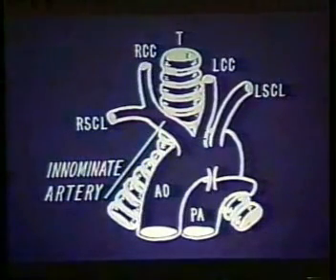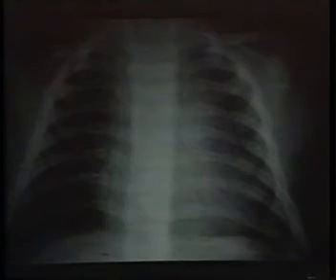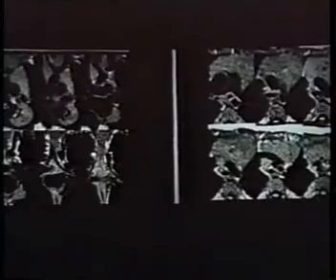These patients will have normal esophagrams, usually normal chest films, but the abnormality will be recognized at bronchoscopy, and then you proceed to MR. This patient has normal chest films and clearly had respiratory stridor. The lateral chest film demonstrated some anterior compression upon the trachea, but you can see this in many normals. The esophagram, illustrated only for completeness, was normal. At bronchoscopy, the surgeon described complete collapse of the trachea by a pulsatile vessel passing obliquely approximately 1 to 2 centimeters above the carina. And for that reason, the patient went to MR.